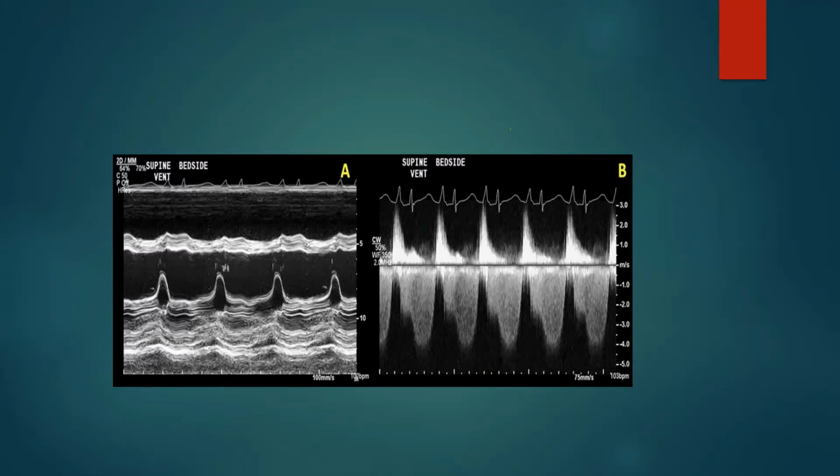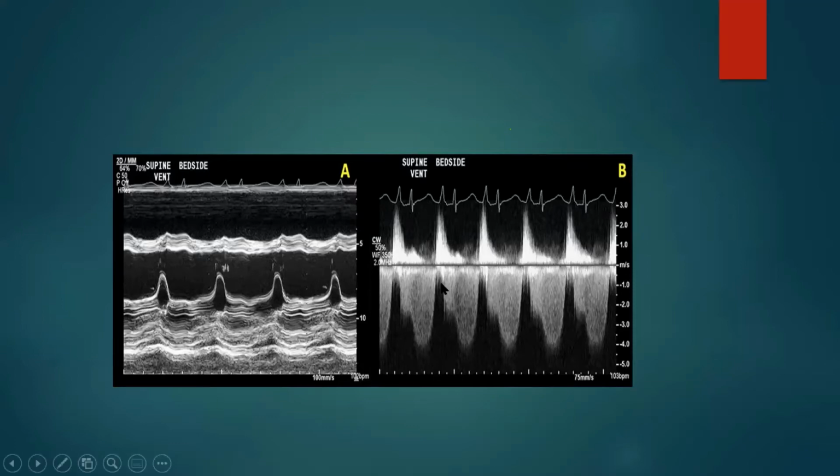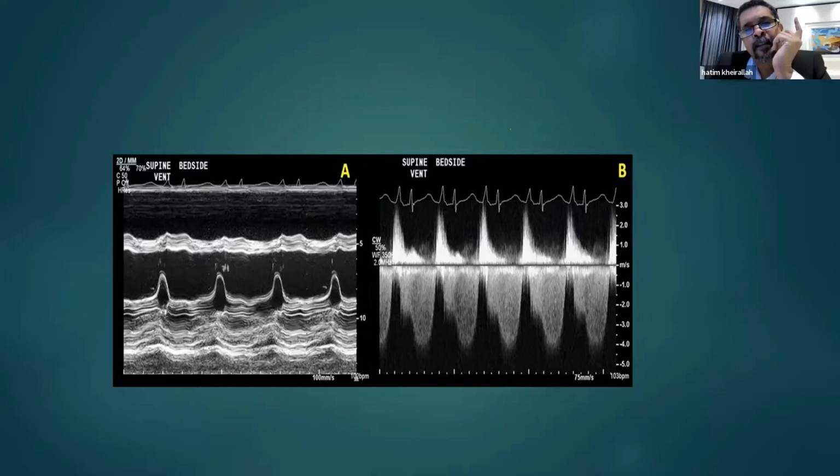Why? So why did you say acute valvular regurgitation? I think that was Sarah. Yes, me. There is a diastolic flow in the continuous wave Doppler. This one here.